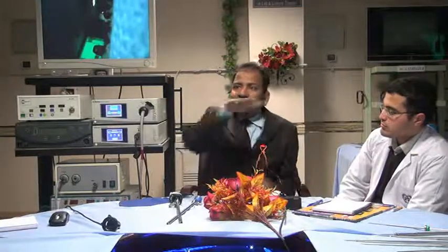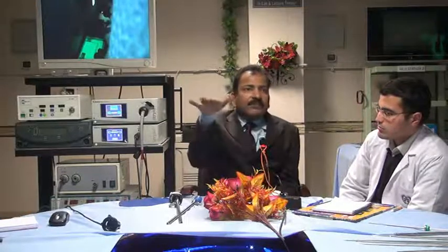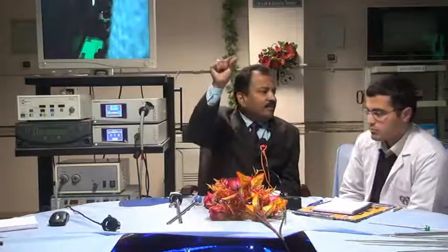Why not orange or brown is used? Because white is the middle of the spectrum. So just like an equalizer, any color you can bring up or any color you can bring down. If you use red, balancing doesn't have green or blue at all. But white has equal proportions. So any color can be minus, any color can be plus. That's why white balancing is used.